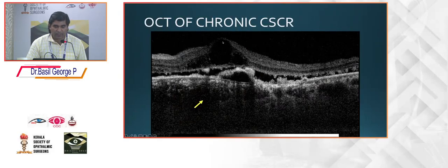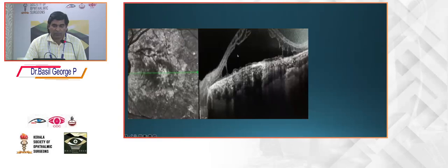The other findings include intraretinal cystoid space in this variant called the cystoid macular degeneration or the CMD. This is a picture of late cystoid macular degeneration or the CMD, where the subretinal fluid has disappeared or resolved and there are large intraretinal bullae of the cyst.